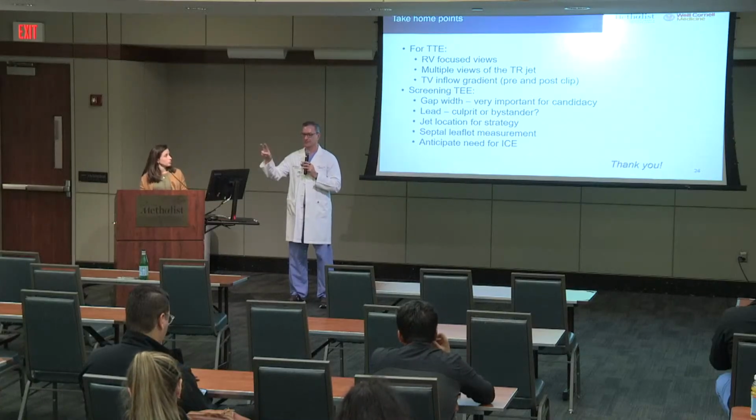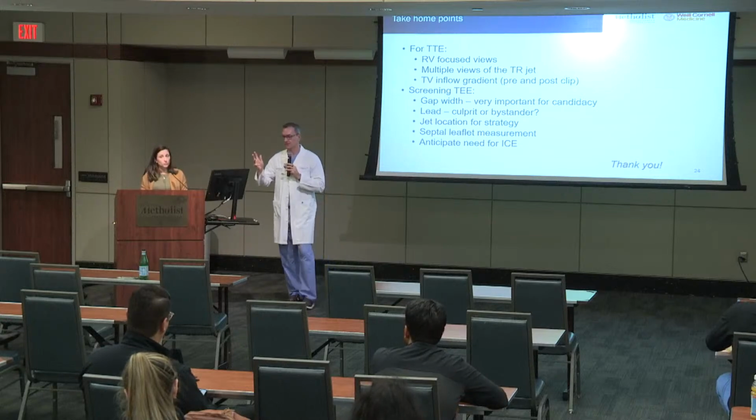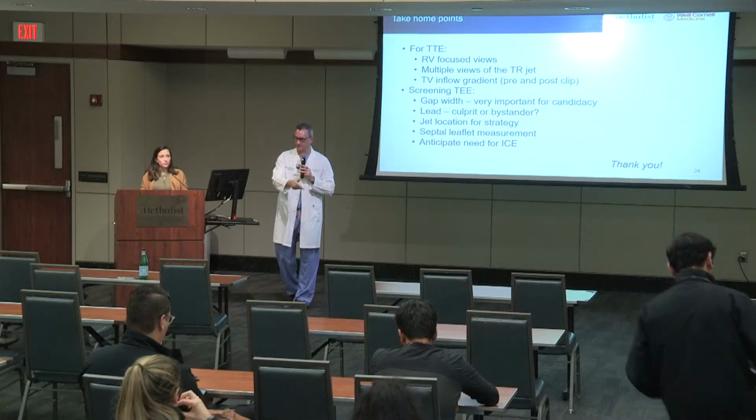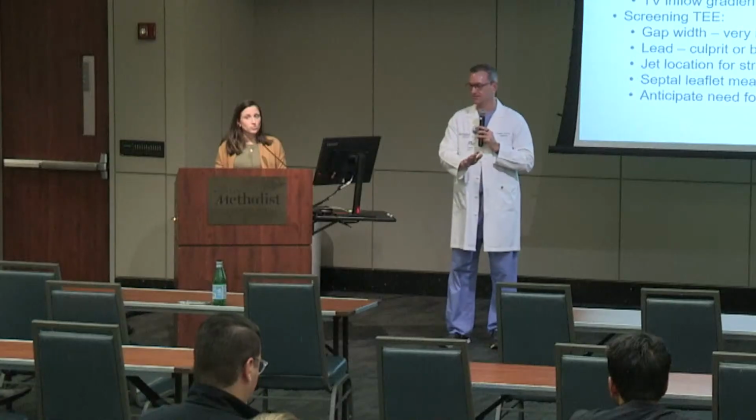This case had 2 mitral clips, 2 RV pacer leads. That's a lot of hardware. Complex jet. We thought we would need ICE. But the approach is open it when we need it. So we had it in the room. The discussion was, should we open it? I said, no, let's not spend the money till we have to. And let's just try with TEE.